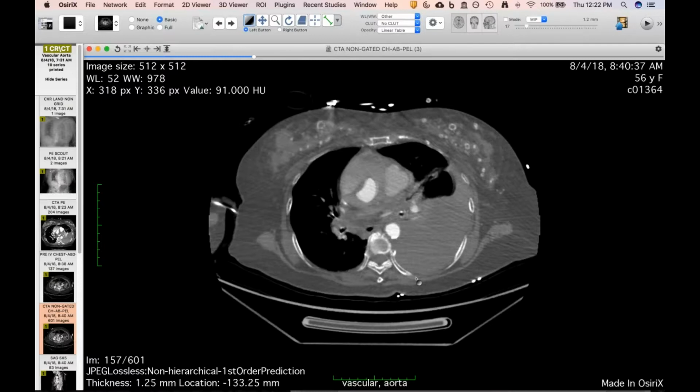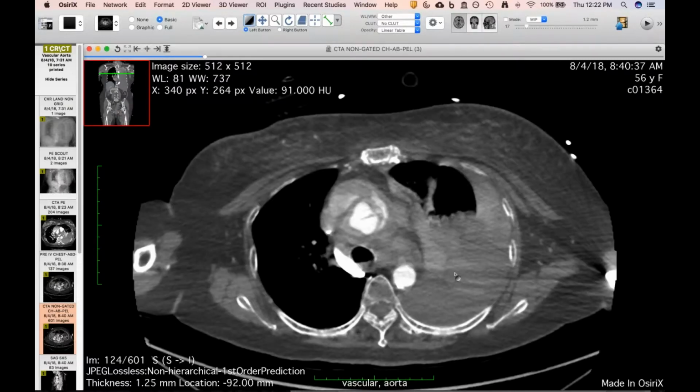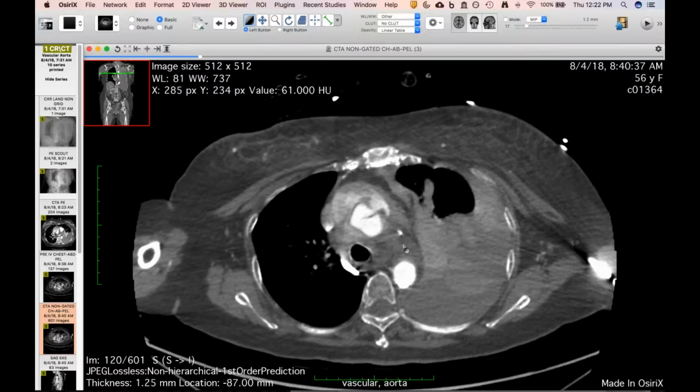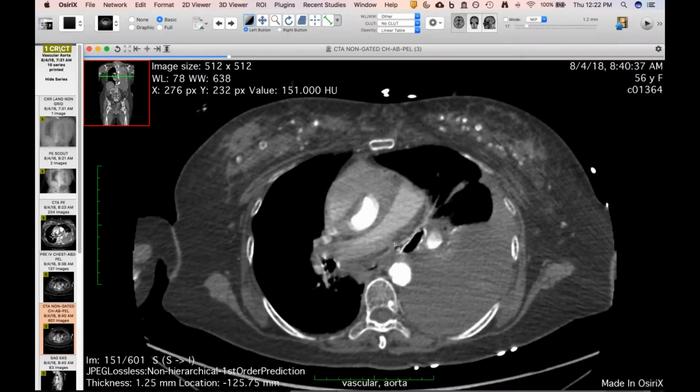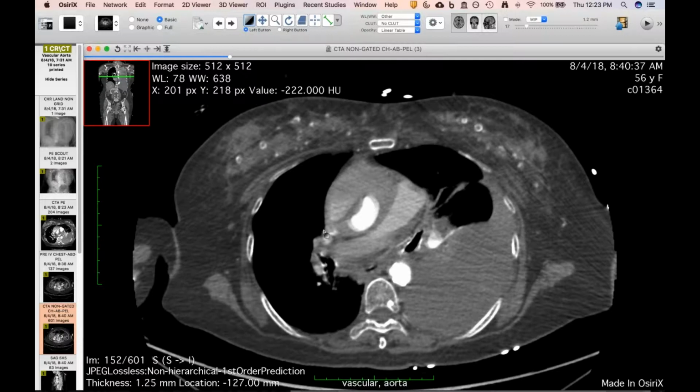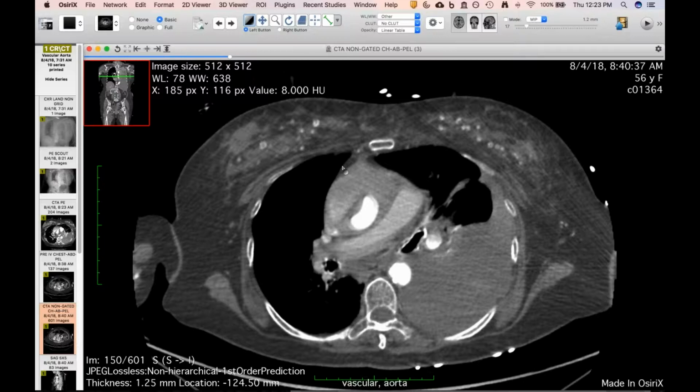But this patient passed away shortly after this exam, but it's just an interesting time sequence of seeing contrast in different spaces at different times. And I think, Howard, you'll agree there's a little bit of shared sheath hematoma as well, in this case along the pulmonary arteries. No surprise. Sure, looks, yeah. And then just a bonus, I think she had free silicone injection into her breast at some point in the past.